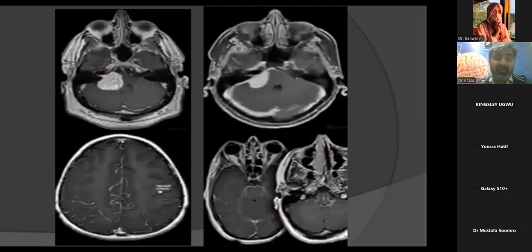These show the dural enhancement. What kind of enhancement is present here? This one. Leptomeningeal? Very good. Leptomeningeal. Here it is cortical. Here it is basal. So most likely tuberculous shows the leptomeningeal enhancement. And the bacterial pathologies, the infections, they also show the leptomeningeal enhancement.